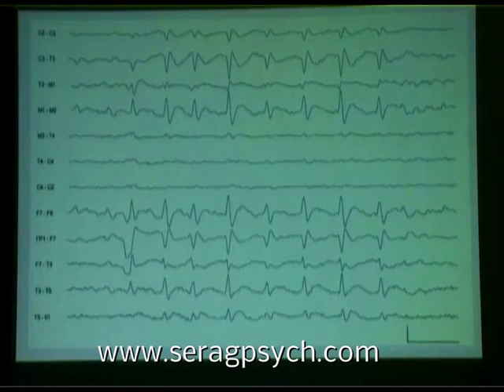But notice how that spike location, you see you have this down, down, and up. That's actually phase reversing at T3 at that point. But notice this one doesn't do that, right? Two temporal spikes, one next to the other, and this one is canceling between F7 and T3, okay? So this one is a little further anterior than that one is. And so you see these slight variations.